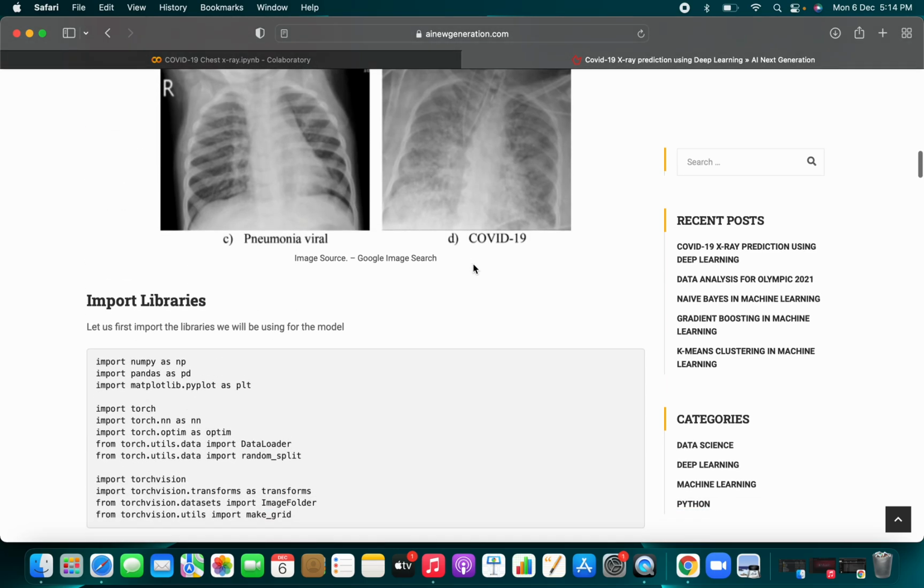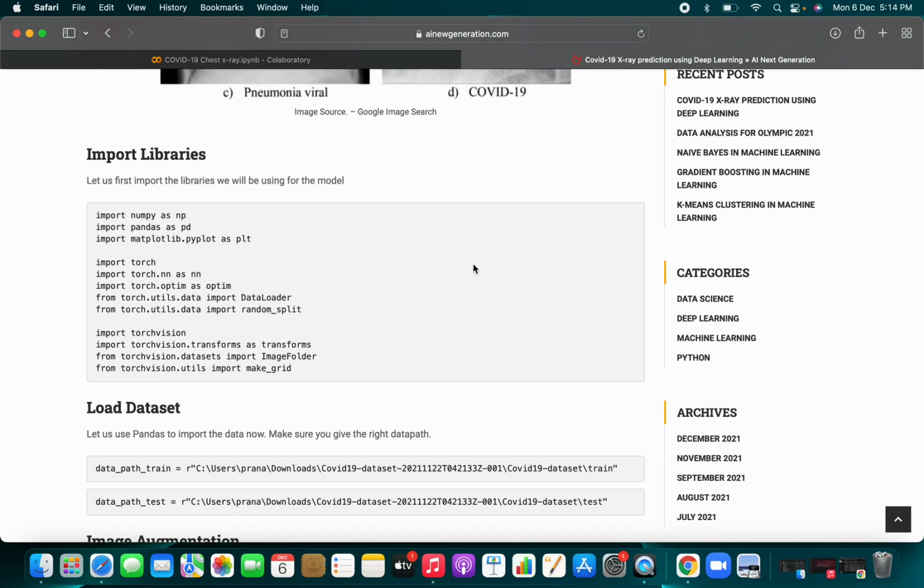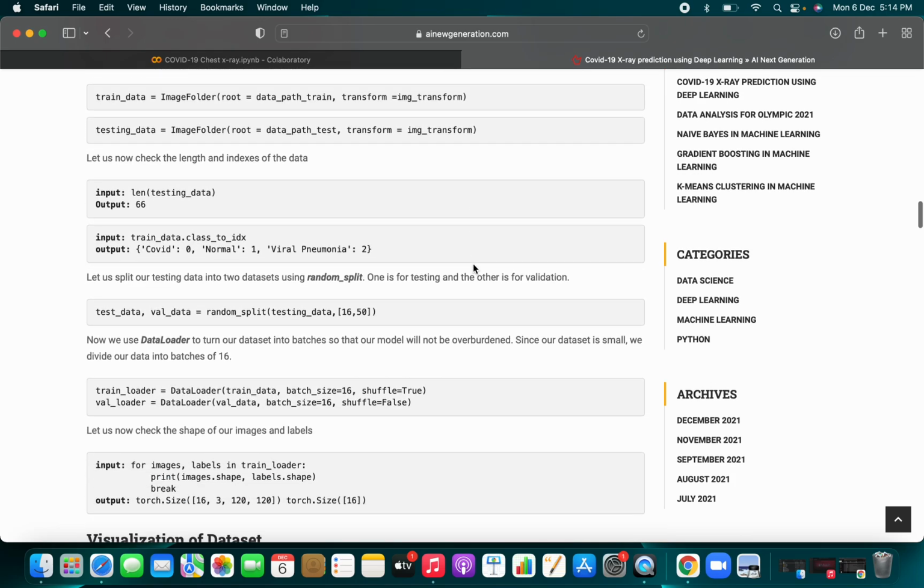In that, I have already shown you how we have gone through import libraries, load data set and various kinds of things. Okay, so if you have not watched the part 1 video, you must go and watch it, so you will understand how we are going to flow and how we are going to use the data set.